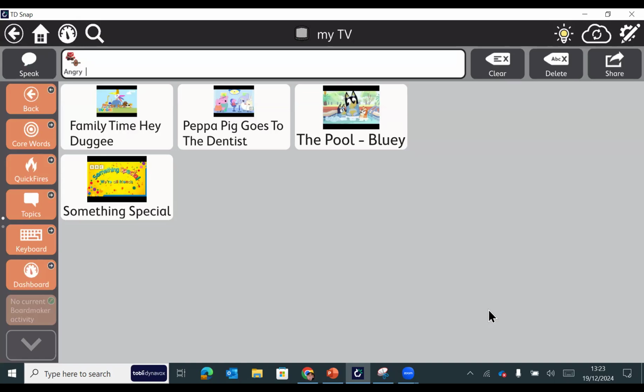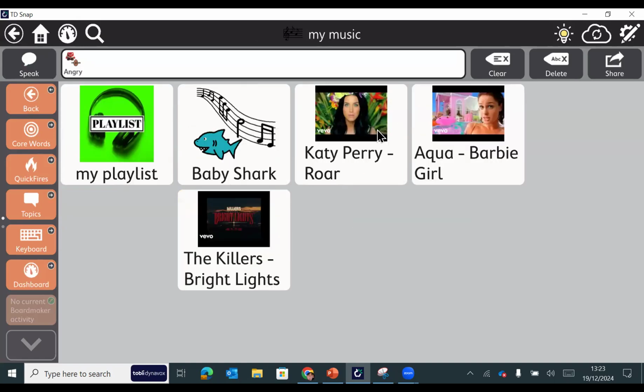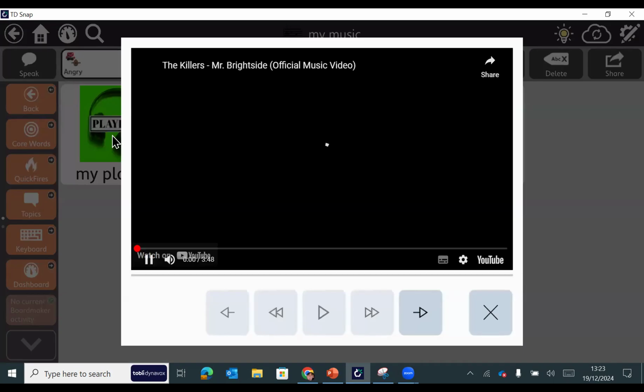So what I want to show you is if I go into maybe my music, I've got the ability to create a playlist as well. So I can click on here and you'll learn a lot about me now. I'm a big Killers fan.